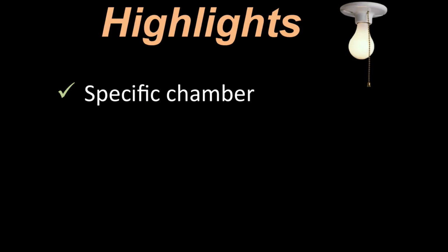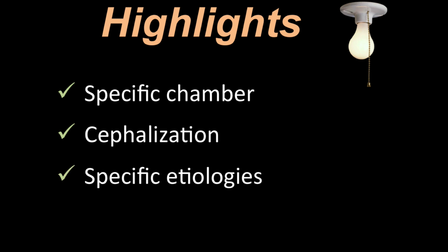Now that we finished the first case in the pile, let's talk about the highlights of this case. First of all, whenever you see cardiac enlargement, try to decide if there are specific chambers that are dilated, because that's going to guide your differential diagnosis and subsequent management. Whenever it's a cardiac case, make sure that you do not have pulmonary edema. When it's interstitial or alveolar pulmonary edema, that's easy for many people. However, for you as a seasoned radiologist, you have to see the earliest signs of pulmonary edema. By that, we're talking about cephalization, which is equivalent to pulmonary venous congestion.